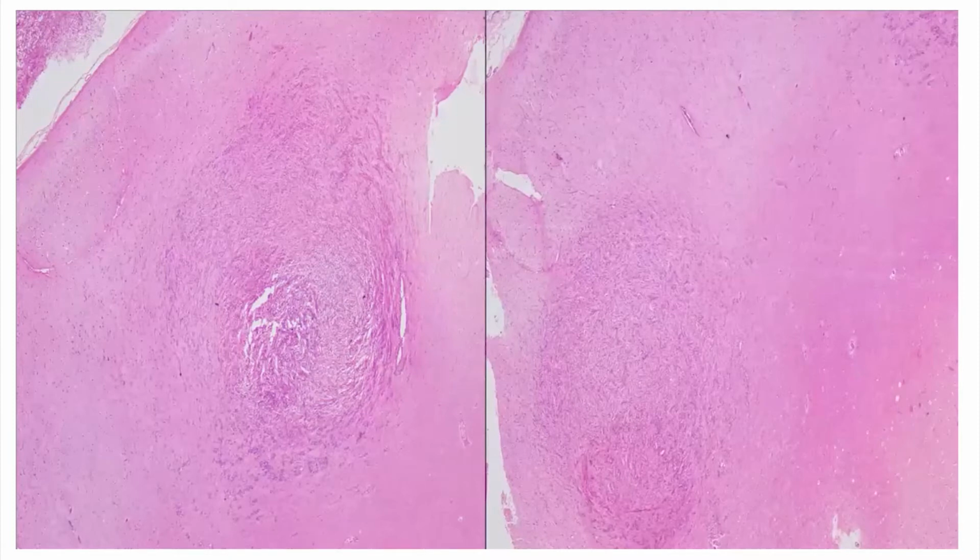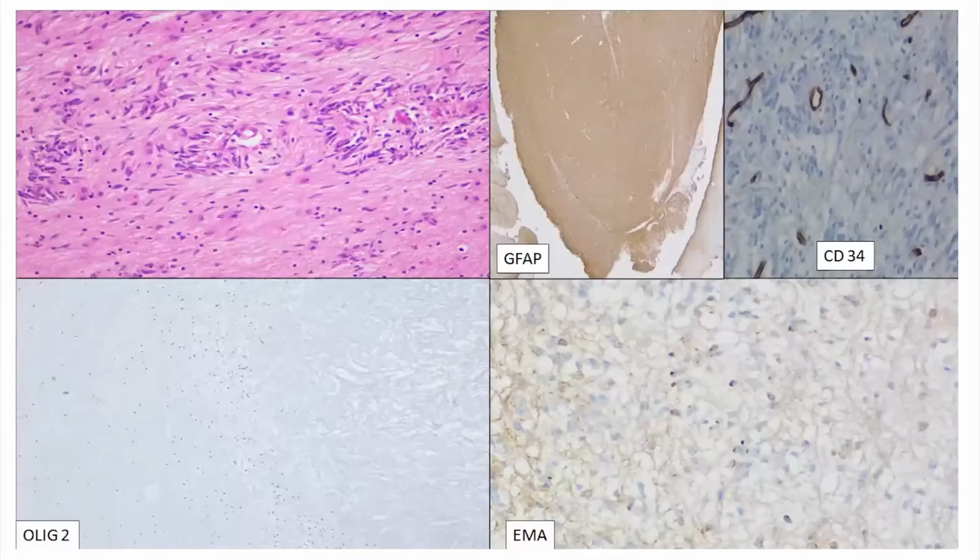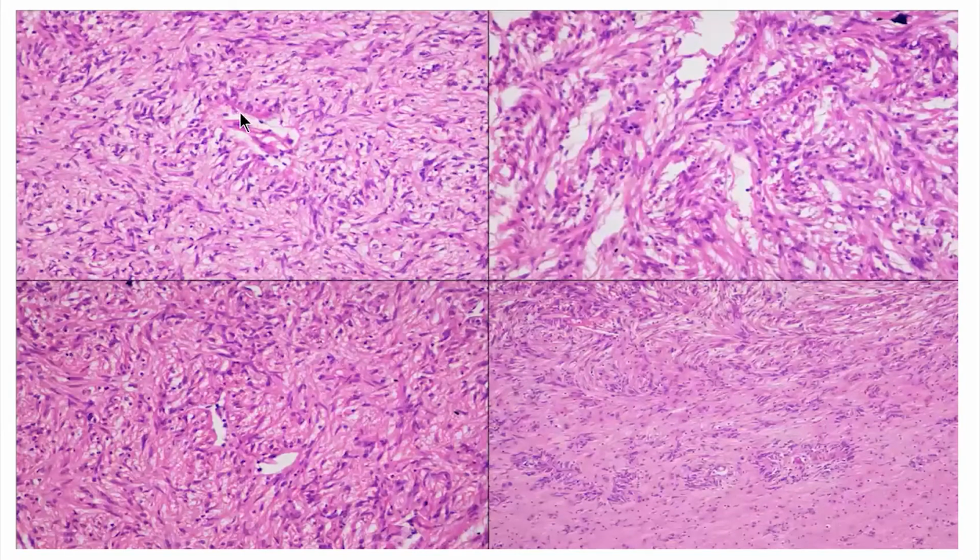And Ki-67 is very low in angiocentric glioma. Supratentorial ependymomas have poorer prognosis compared to all other locations, and they generally have a high Ki-67 index. And the cellularity is also not like that of ependymoma. I will show you the cells in ependymoma. They are not spindle shaped. They are monomorphic, present in a very fibrillary matrix. Here they are spindle shaped, although they are arranged around vessels. But the arrangement around the vessels in supratentorial ependymoma is a bit different.